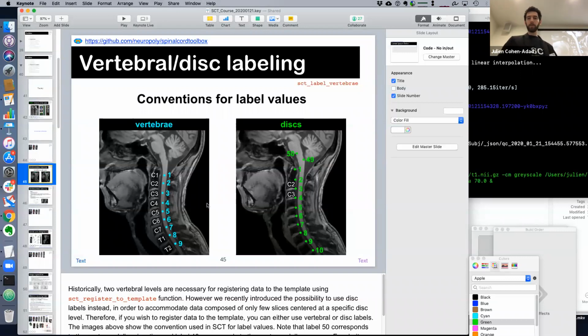Alternatively, that's another feature that came, I think, after an email that Folk sent me, I think 2 or 3 years ago, telling me that he does not have any vertebral body in his fMRI scans, and he only sees the disc. So Julien, can you please make a picture so that we can label the discs?